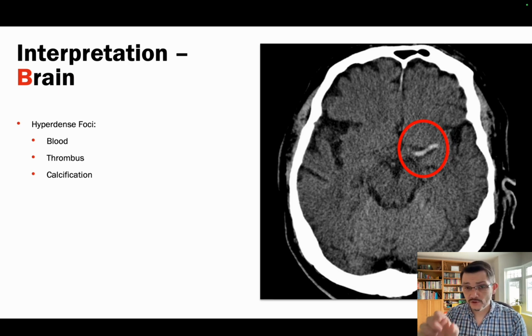That artery is occluded. That needs to be either dissolved or it needs to be removed by mechanisms to treat that stroke. Otherwise, the brain tissue supplied by this artery is going to be damaged. So this is a major M1 thrombus that needs to be removed.